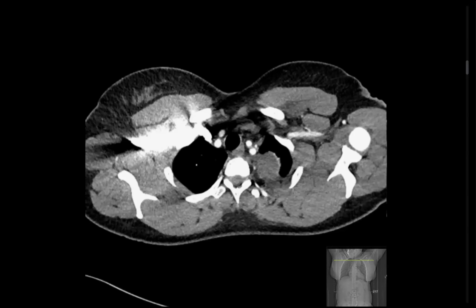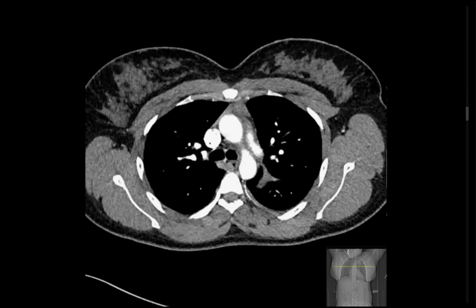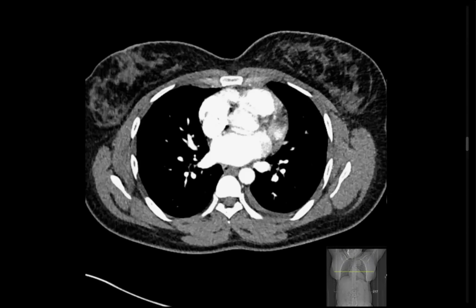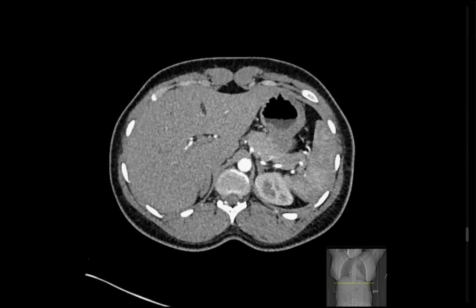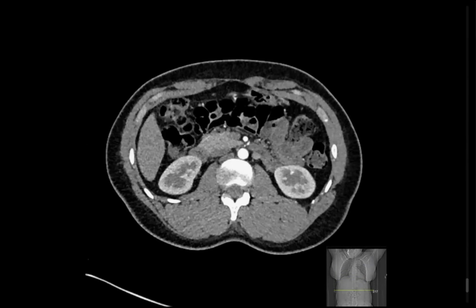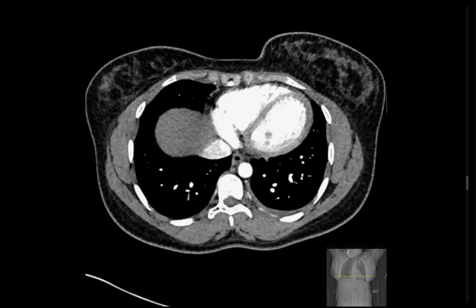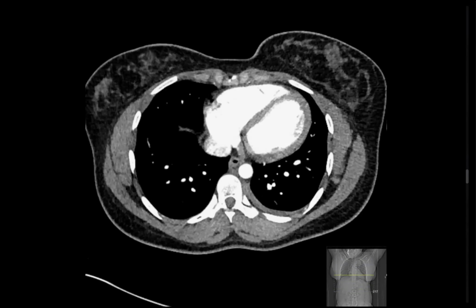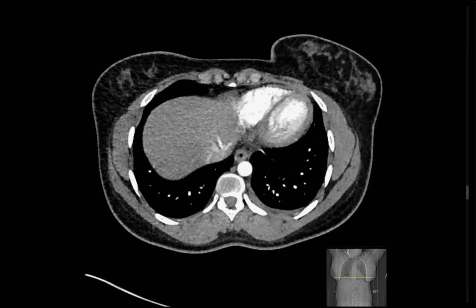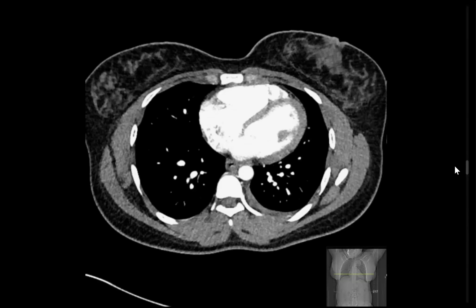Yes, better. I'm presented with chest CT axial cuts. I will proceed till the last cut and give my comment. Sorry, it's lagging.